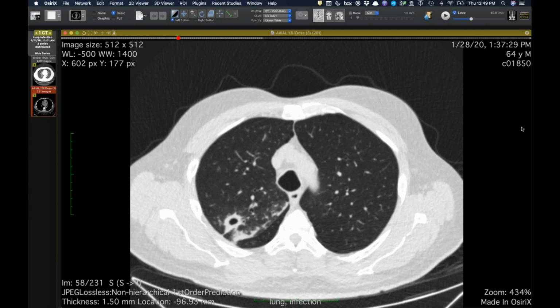But I've seen plenty of mild cases in older females where it's just in the anterior lungs, and there's no involvement really of the apical lung, and no suggestion that there ever was. I've seen a number of the little old ladies who are not smokers with this distribution, usually not as severe as this, of course, more of a tree-in-bud sort of thing.